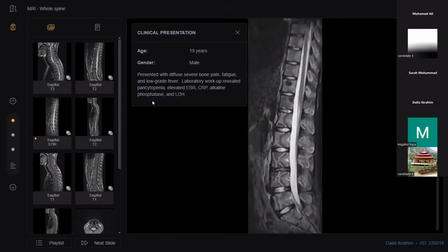Leukemia, lymphoma. Muhammad said hemophilia or blood disease. Exactly, in sickle cell, as I said, in a 19-year-old patient it will be established sickle cell disease, so you will find the spleen small, and they call it autosplenectomy, sclerotic and or calcified spleen. But in this case no, we have hepatosplenomegaly, we have diffuse abnormal marrow signal, we have multiple marrow infiltrations.